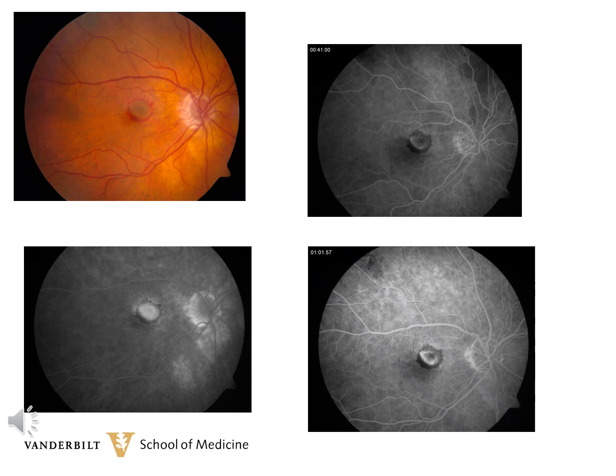On the fluorescein angiogram, the membrane lights up early because there's no RPE in front of it to block the fluorescence. And as the angiogram continues, it becomes more and more hyperfluorescent. If you look closely at the early and mid phase, you can imagine a feeder vessel up about the 1 o'clock to 2 o'clock portion of this membrane, and the vessels are growing towards the fovea.